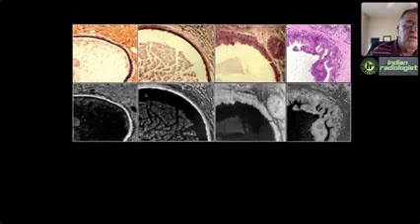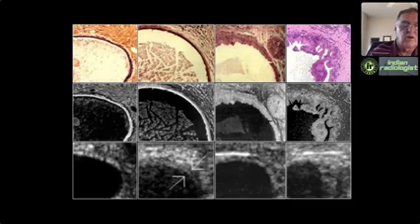So these are pictures of cysts that every pathologist in the world will just call benign fibrocystic change. These are the video inverted grayscale images of those cysts. And these are the ultrasound pictures that correspond. We can now see quite clearly why appearances are what they are.